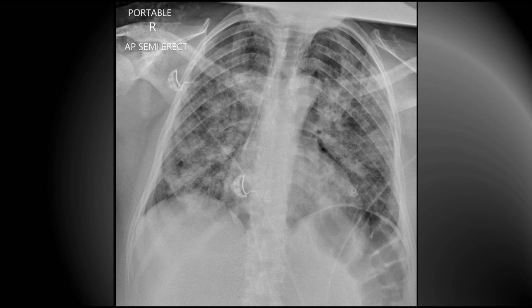Helen is a 45-year-old woman who presented with acute shortness of breath, and this is her chest x-ray. This is another situation where we have bilateral fluffy infiltrates throughout the lung zones, without that characteristic alveolar edema picture. And when you see this picture, you must consider pneumocystis pneumonitis.